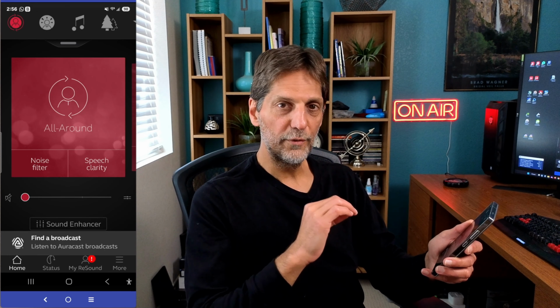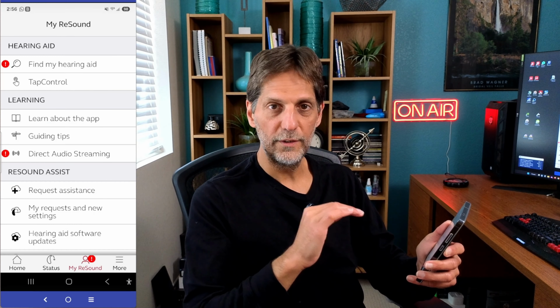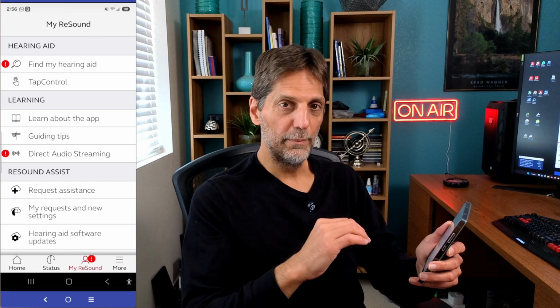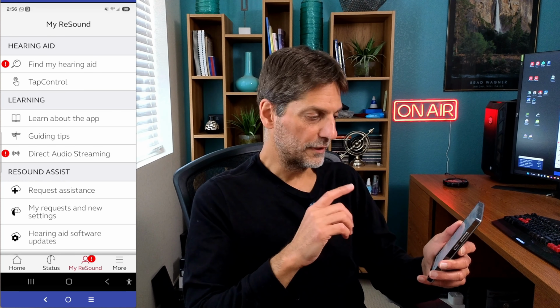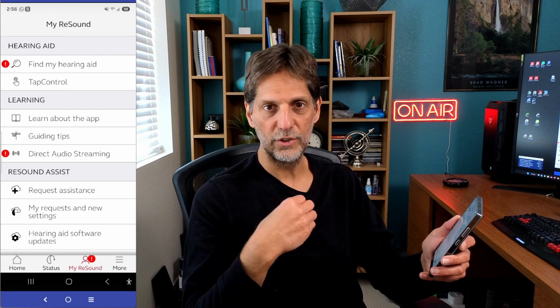Let me move now to the My ReSound section. I'm not going to cover everything, but I'm going to cover the most important things. First of all, you have an option to find your hearing aid. If you ever misplaced your hearing aids, you know how stressful that can be. If you enable the location services for this app, you will be able to click this feature and the application will show you on a map where your hearing aids are in relation to you.